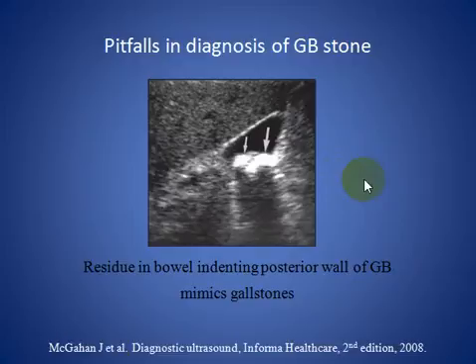Sometimes gallbladder stones are associated with gallbladder wall thickening and complications, and we will discuss these findings in another topic.